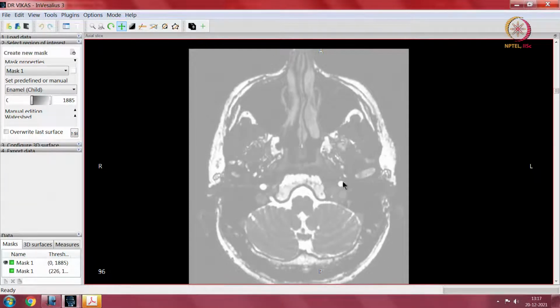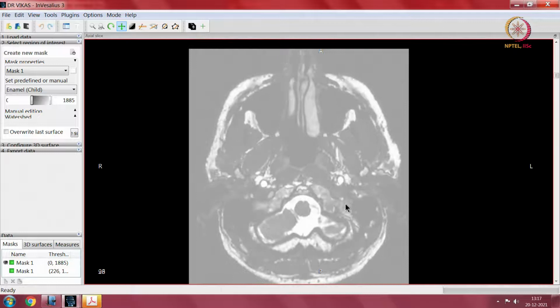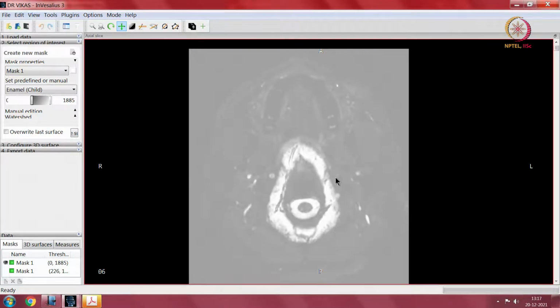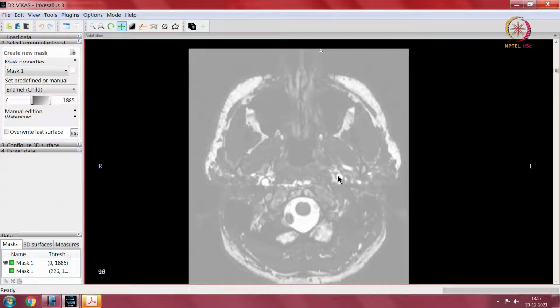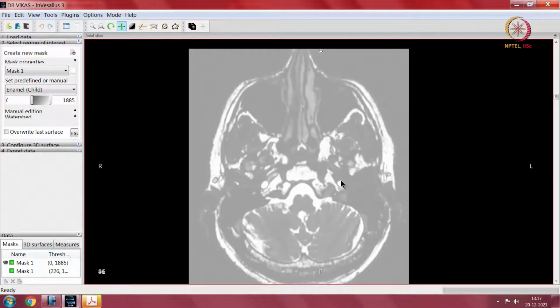These are the blood vessels. These white things on both sides are the blood vessels, the carotid artery which is there in the neck. So, when you do stroke evaluation, this is the target of your evaluation, finding out how these vessels look in your imaging.